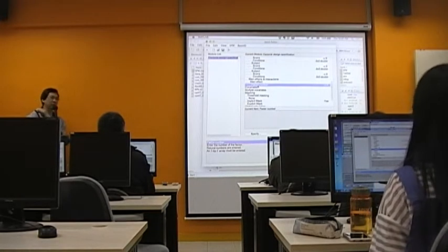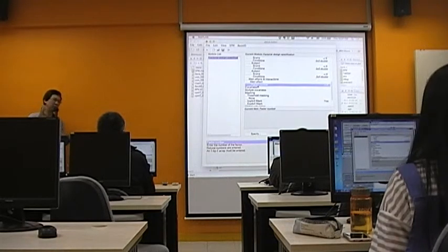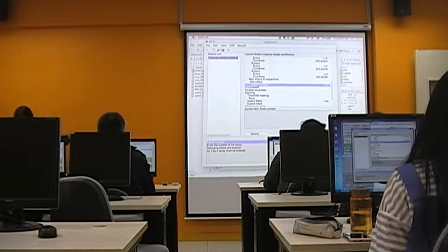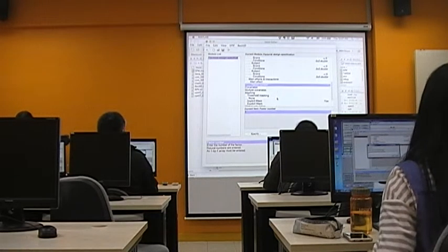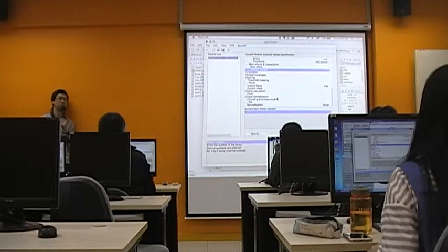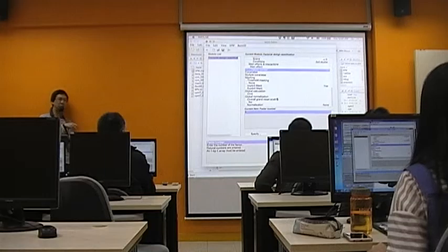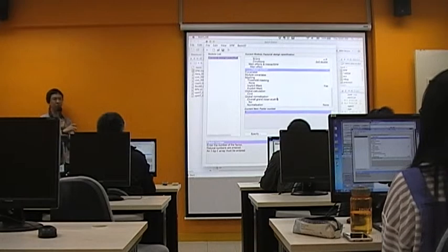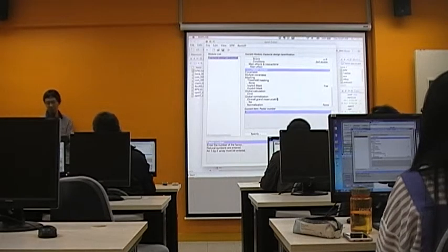So here we have two factors. The first factor is the working memory factor, the second factor is the subject factor. We tend to ignore the subject factor, at least we are not interested in looking at it. So we will simply put 1 as the main effect, and then that's it. So this is the simplest flexible factorial model you could build, which will work in the same manner as when you define the contrast in the first level and then bring the contrast image to the second level for a one sample t-test. This is a very quick demonstration.